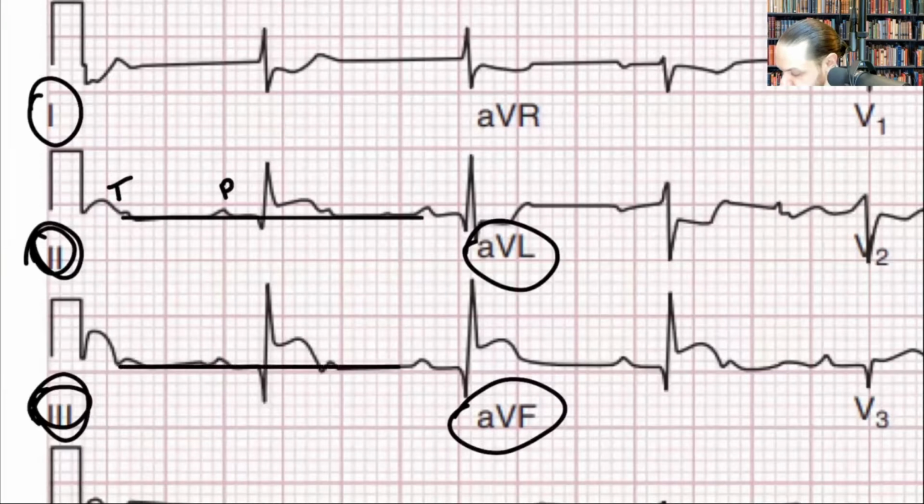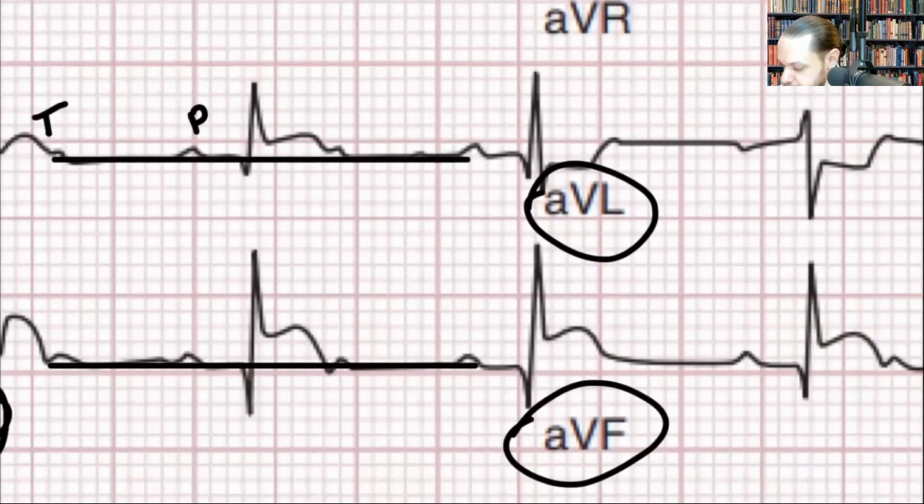When I establish this, I would run an EKG, then print out a little bit more of a strip of paper, and put that paper on top of my printed 12-lead. So I'm not really drawing any lines, because I'm going to show that to the physicians at the hospital. When I fold this paper, all I do is count how many boxes.